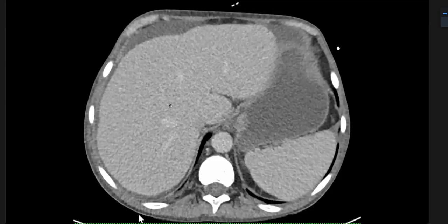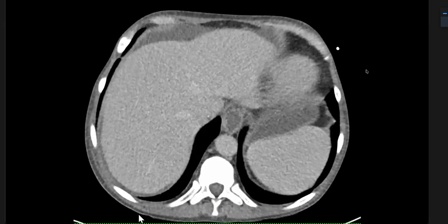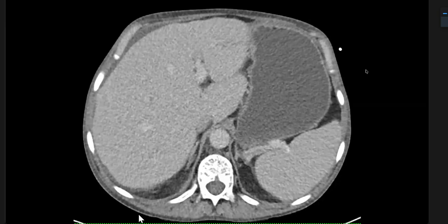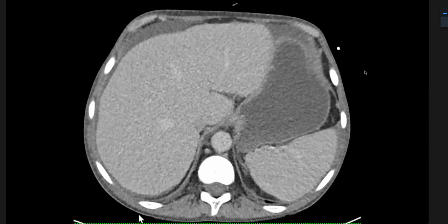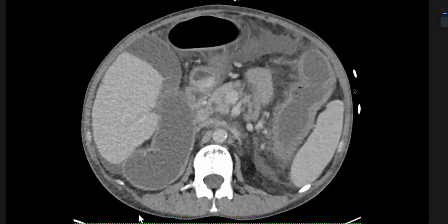Someone presenting with ongoing abdominal pain. I've been presented with a contrast enhanced, axial CT abdomen and pelvis, including lower chest, of a patient who presented with abdominal pain. I would like to scroll the study once before describing the findings.